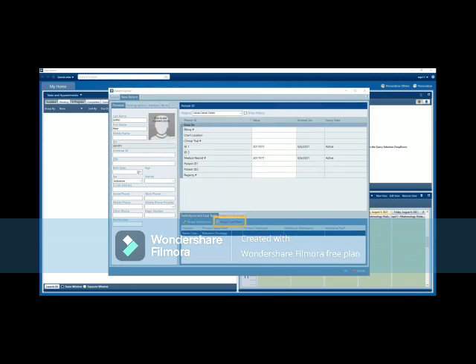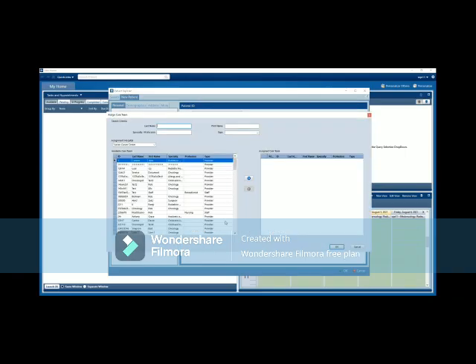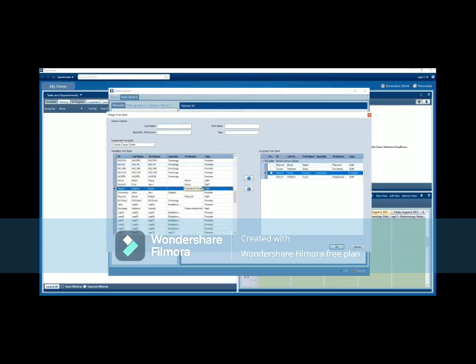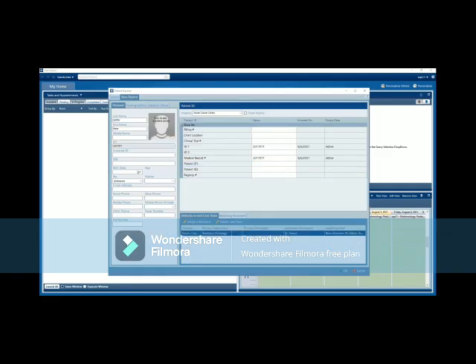Clicking the Assign Care Team button allows the user to add a primary oncologist, as well as other members of the care team. In radiation oncology, this team might include nurses, therapists, nutritionists, etc. When complete, click OK. The Referring Providers dialog is accessible through the Edit button on the Referring Providers tab.